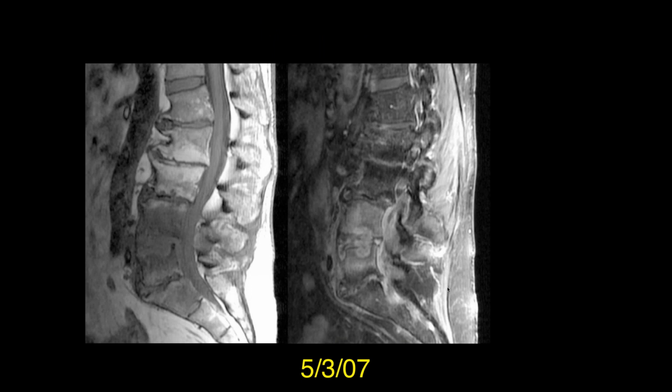So I have two sagittal views of the spine, and there are erosive changes at the end plates at L4, L5, with edema at the adjacent vertebral bodies, and the disc has increased signal also. Yeah, so in the very early days of MR, it was noted that on T1 weighted images, if you lost definition of the end plates like we see here, and you could often see it again on the T2s, that was highly specific for infection. And then here we can also see a lot of edema on both sides of the disc space, these erosions, and then a lot of soft tissue edema back here as well.